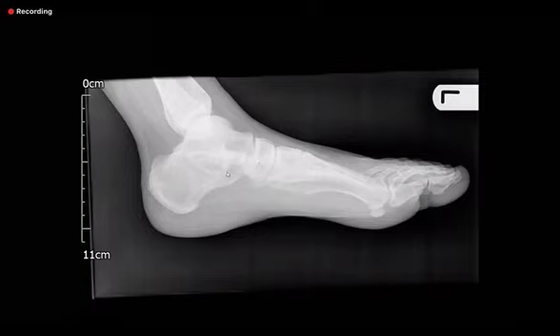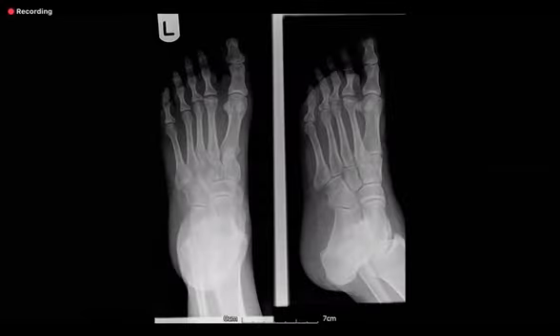Yeah. Okay. Now, on these views, you are worried about talocalcaneal coalition. My question is, on these views, do you see anything to confirm your diagnosis? So on the oblique view, I can see there is loss of the normal joint space between the talus and the calcaneus. The oblique view is just like this, because it is projected like this. Okay. So I'll come back to this. What would you like to do next?